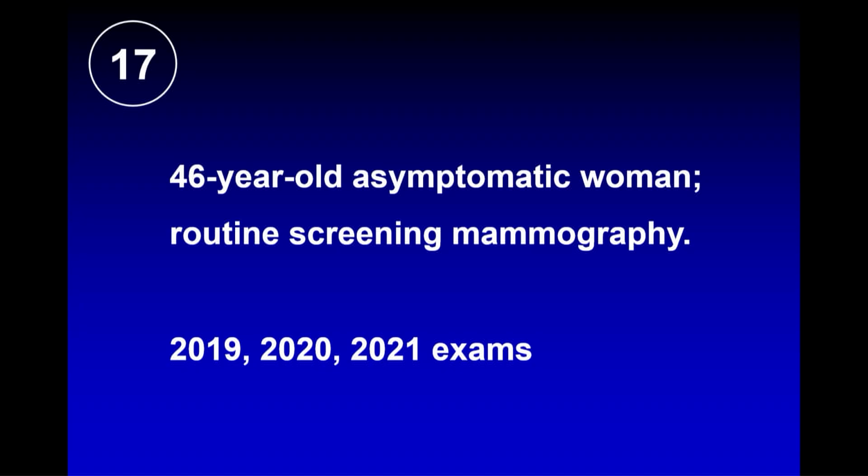Quick hypothetical question. Yes. Going back to this case. Let's just say it was a baseline mammogram. You think that the focal asymmetry on the right side should have been recalled, but it wasn't. It was let go. She comes back a year later, and now you're reading it, and you see the focal asymmetry. It hasn't changed, but now it's only got 1 year stability. Okay. So are you going to recall it? Or are you going to just let it go? Because theoretically, it should be in a BI-RADS 3 category. Well, it could be a BI-RADS 0 for the focal asymmetry that appears to be stable for a year, but that's all you've got.